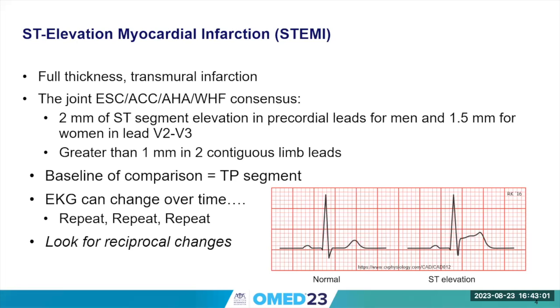And again, we know that there's a lot of things that can cause ST elevation. We'll go over some other items after this, but you really do need to consider the worst thing first, right? That's kind of our job in the emergency department, in urgent cares, et cetera. Really though, keep in mind that clinical picture. This is a clinical syndrome. You're going to have characteristic symptoms typically, although in women, we know these things can present in different ways. And this is going to eventually show evolution of elevation of our biomarkers as well.